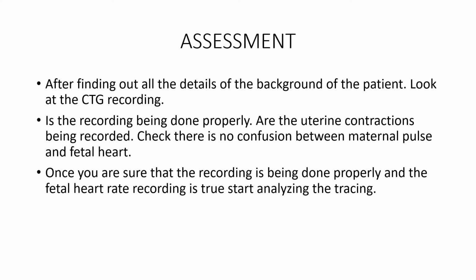After finding out the details of the background of the patient, now we will start the assessment process. Before actually reading the CTG, you want to know whether the recording is being done properly. Are the uterine contractions being recorded? You will know this if the bottom half of the graph is also showing a recording.